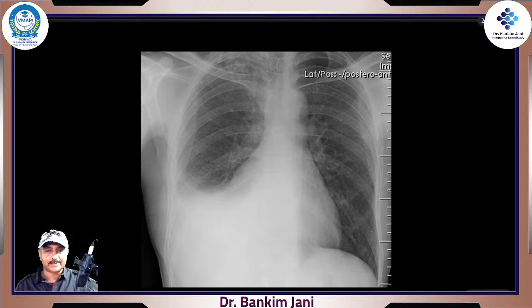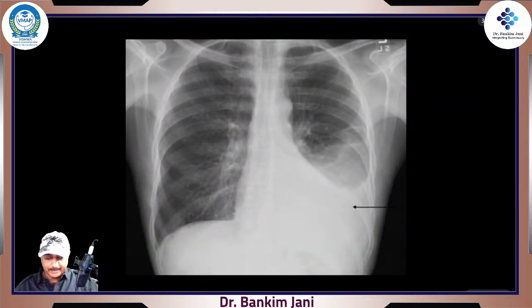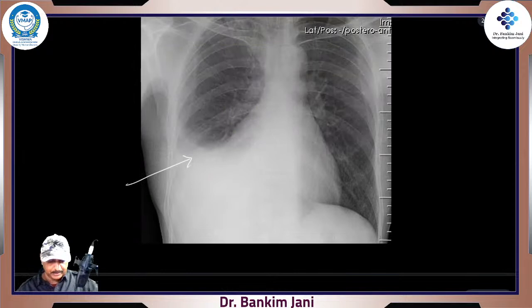Yes, we saw this clearly, a massive pleural effusion. Watch one more. See here, relatively less, but still quite high. What you will see very crisply is this fluid level. It would be like this. See, again over here, a beautiful fluid level.